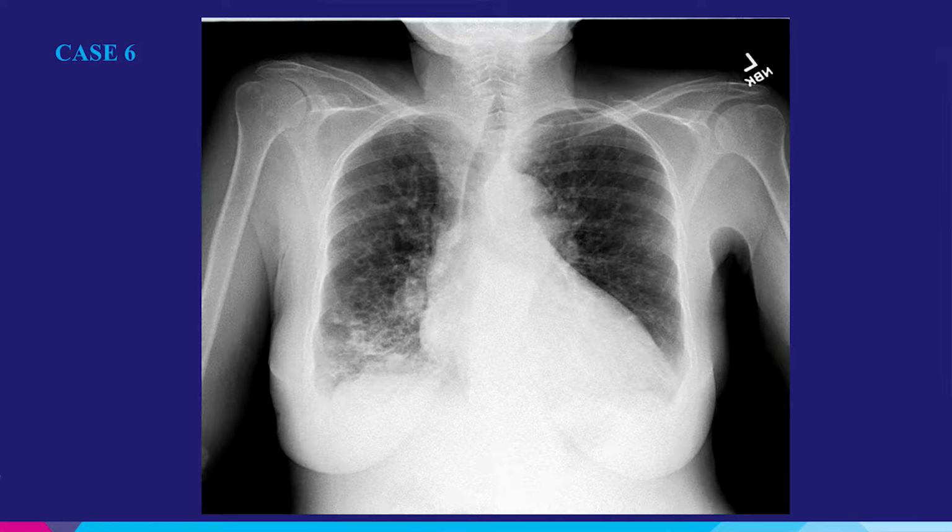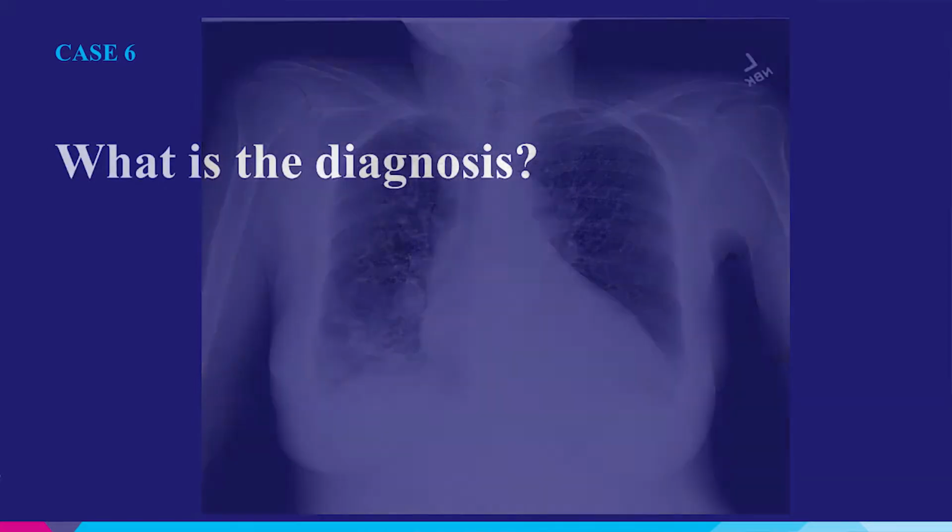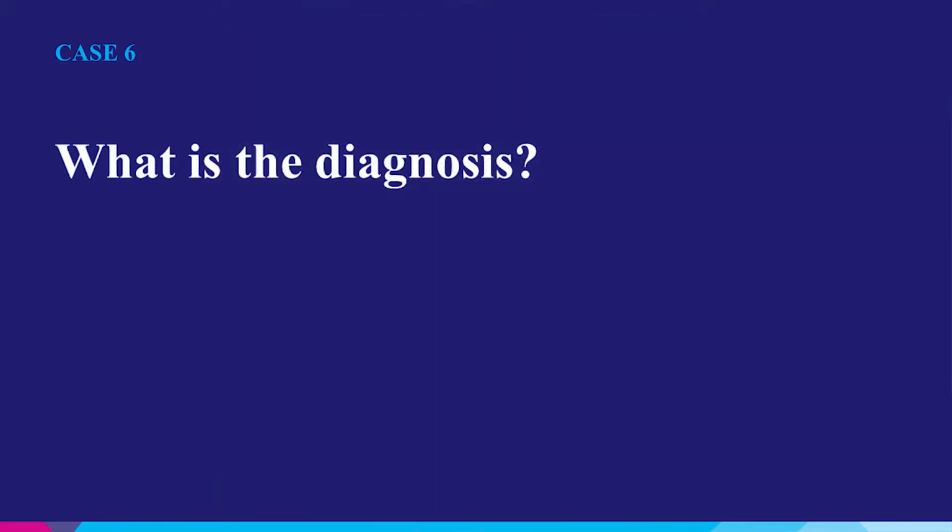And if you want to have a differential for them, we could say they are dilated bronchi, or let's say centrally lucent lesions here, here, and then increased bronchovascular markings and maybe some reticulation. So basically, a lot of findings that we can make based on this chest X-ray, but there are a lot of possible findings that we don't have a definite answer for. Well, for this patient, we also did dynamic imaging, and the next one.